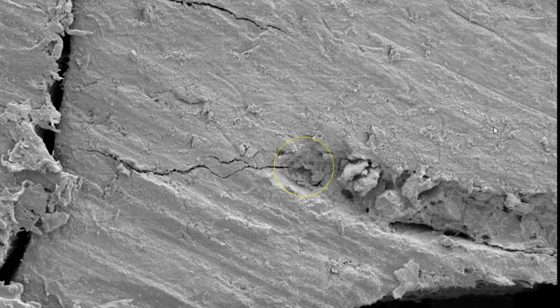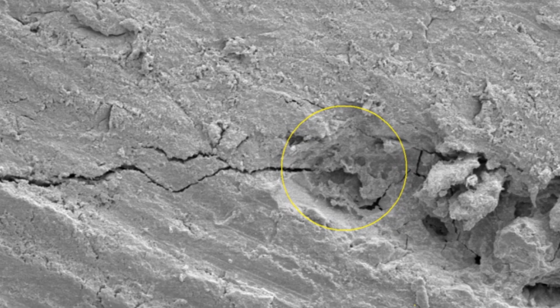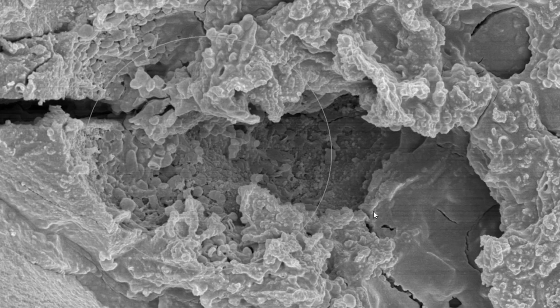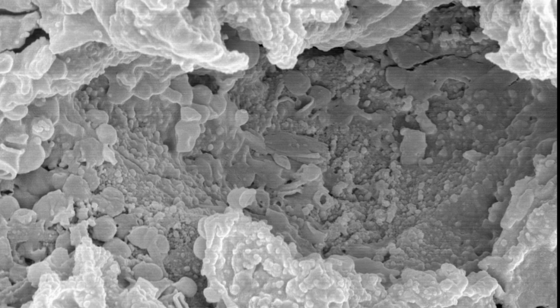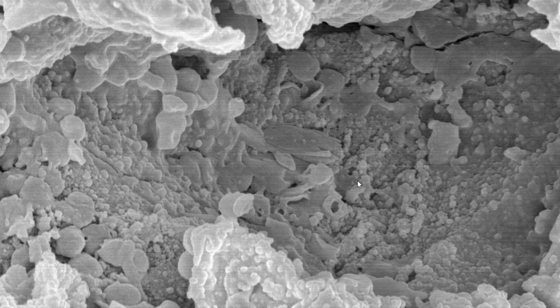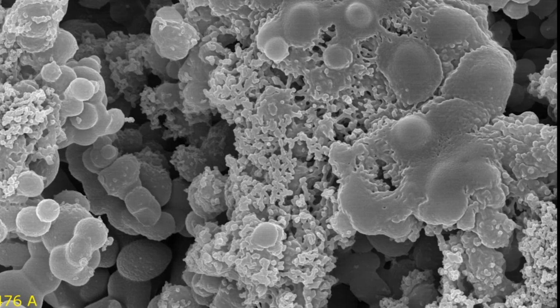And when you look closely at this, this is at the very tip of that finger. And when you look closely, it isn't any surprise what you see here is a lot of fungal and perhaps bacterial overgrowth. Again, you have to look at these at fairly high magnification to really be able to see what is going on there. And again, this looks very fungal in nature to me.